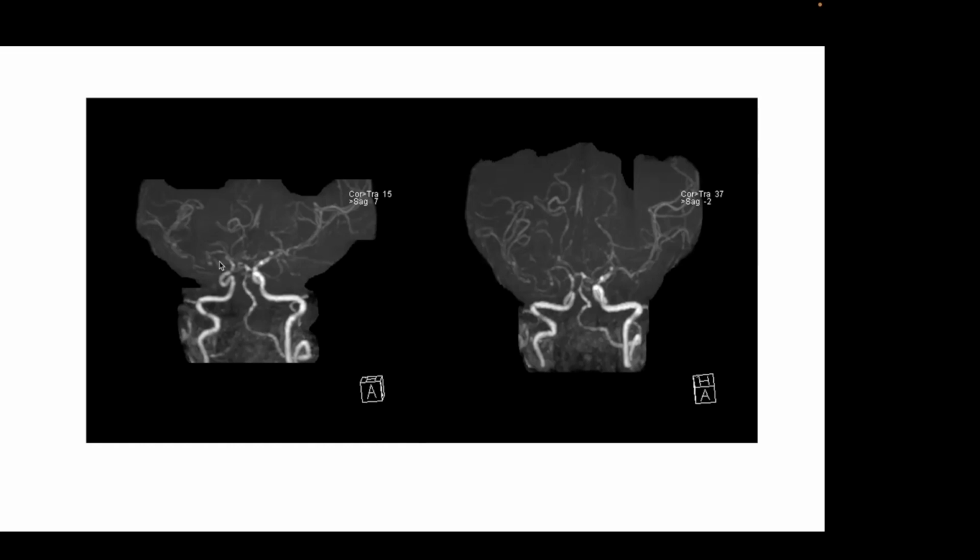So I wanted to show you this case. This is a patient with a distal carotid stenosis, with impaired flow throughout that whole vascular territory, but with collateral flow making up for the impaired inflow. And this is a patient with radiation vasculitis, probably from their childhood leukemia and the radiation, they went on to late arteritis.